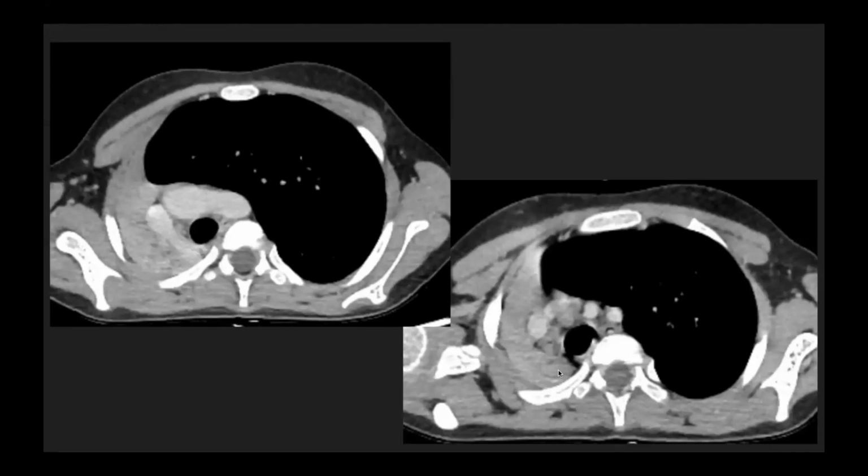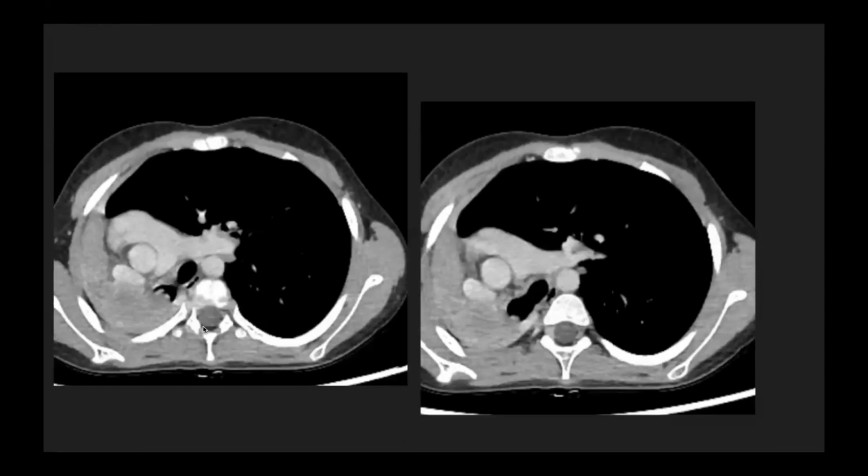In the CT we can see this is the collapsed lung, and this is the mass that we saw so well on the ultrasound. This is the mass which has an intraluminal component within the right main bronchus, and this peripheral part is the collapse. Now, on a routine CECT, the difference between this lesion and the peripheral collapsed lung is not that well demarcated, like we got to see on ultrasound. You have to accept that the difference is much more pronounced on the ultrasound image.